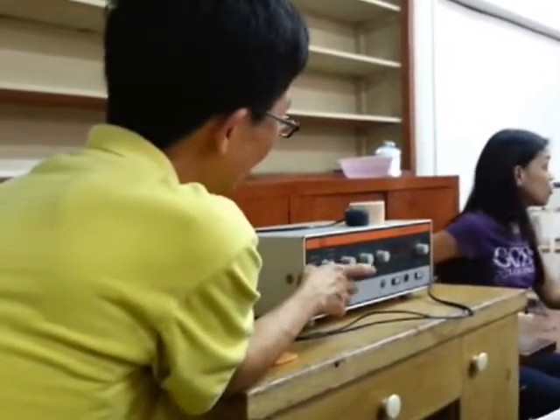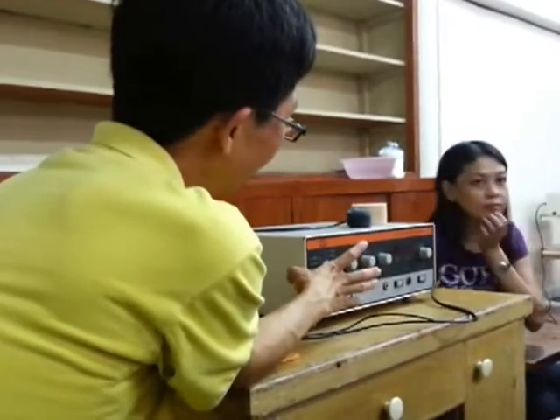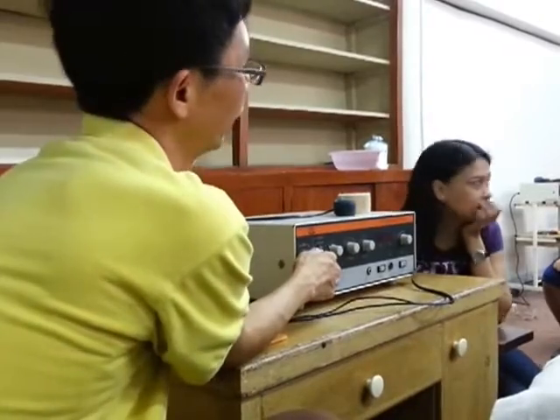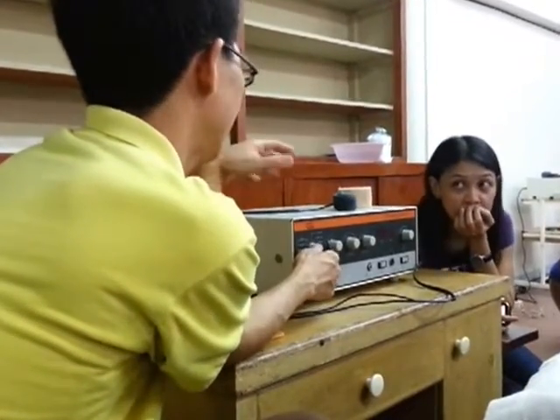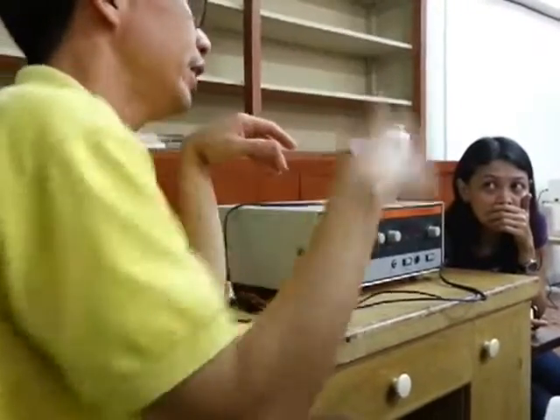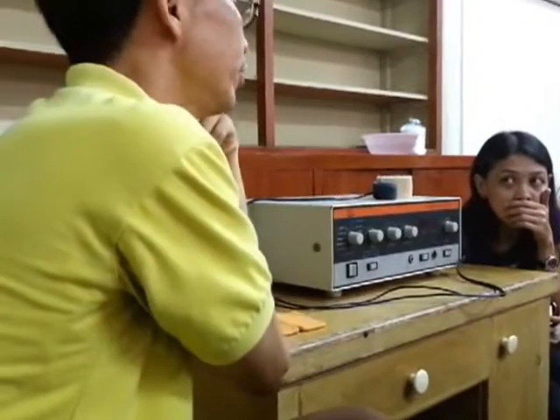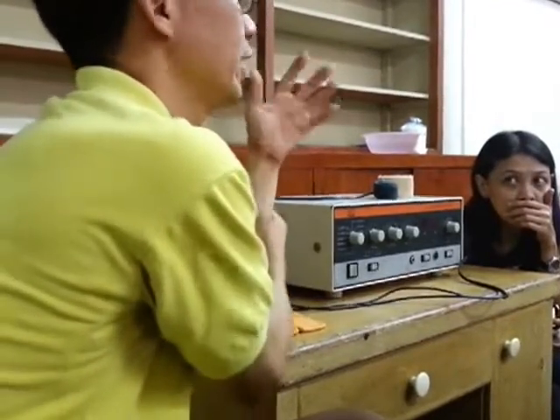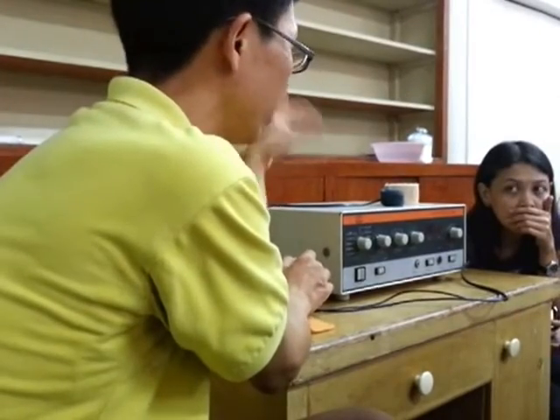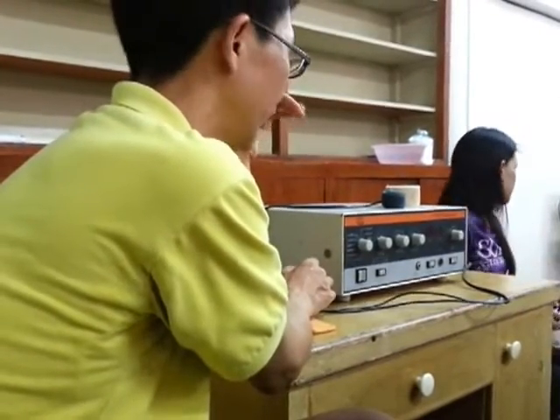Okay, so we simplify this approach for OT. Here, you have your triangular, rectangular waveform, and this would be surge. Usually when you have this surge, this is a slow or gradual increasing and decreasing of the intensity. There are several currents produced, but with increase and decrease. So you usually use this surge for tetanic contraction. For muscle twitch, you can do without the surge.